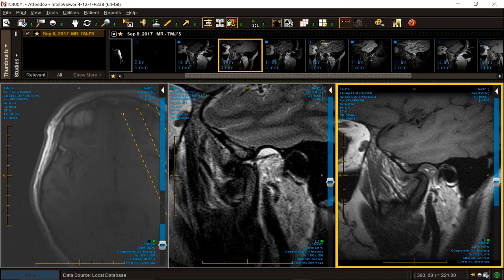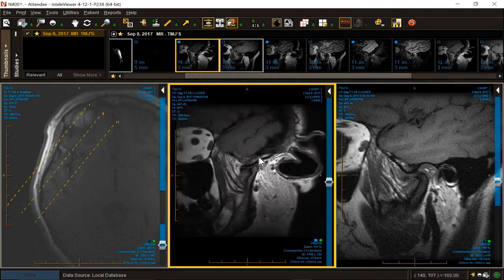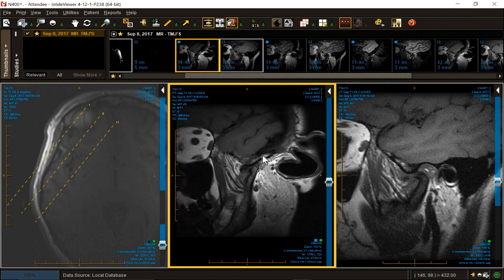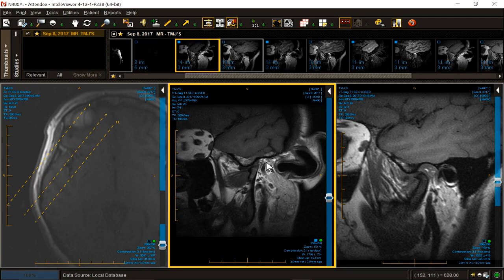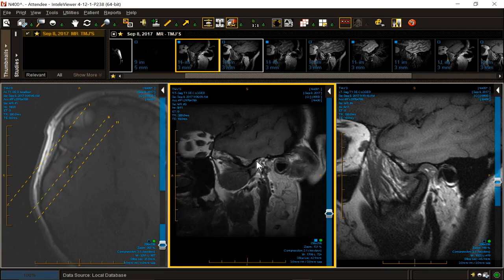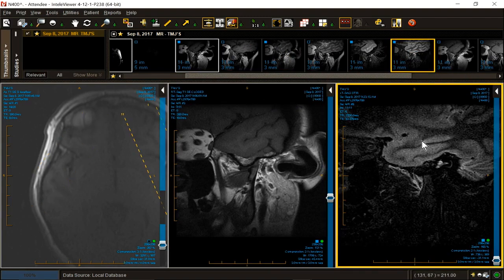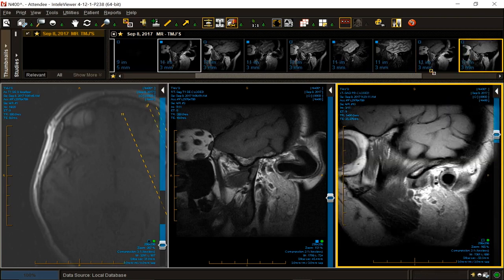Right TMJ. Let's go to the right. Right TMJ, American Dental Association criteria, class 3 to 4 displacement, partial open lock, torn attachments, arthrosis predominantly on the condylar, but less so on the temporal side. And then let's decide how much translation we have. Let's go to the after. The open on the right.